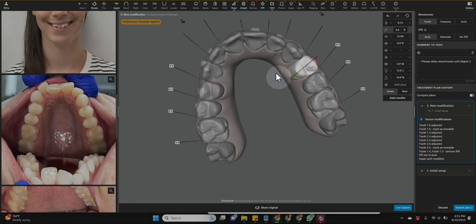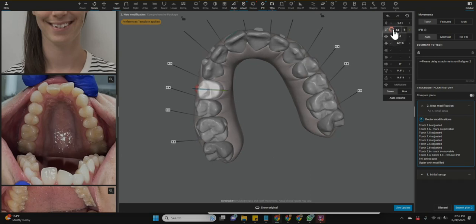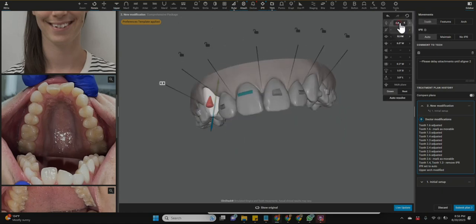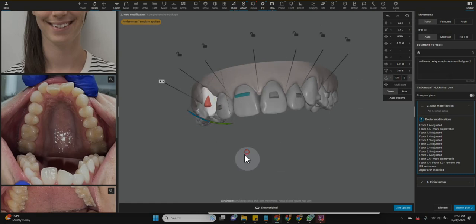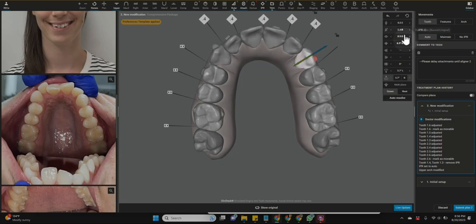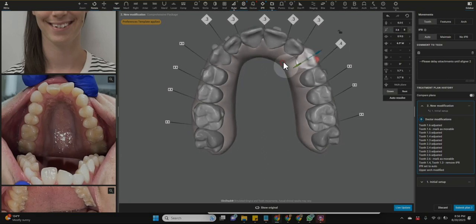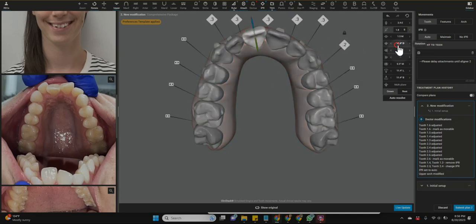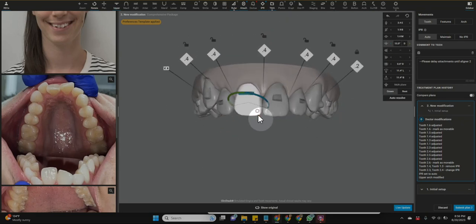So now I want to bring the first molars more in the arch form that we set up for the molars and then canines as well. And when we do this type of expansion, and it can be with translation or with tipping, then we see the anterior round out a little bit and we get that more rounded U-shape arch rather than the V-shape arch. And you can see how some of those 0.5 millimeters of IPR have already dropped down. I'm going to make sure that this tooth is rotated in, although that's not my primary concern right now.